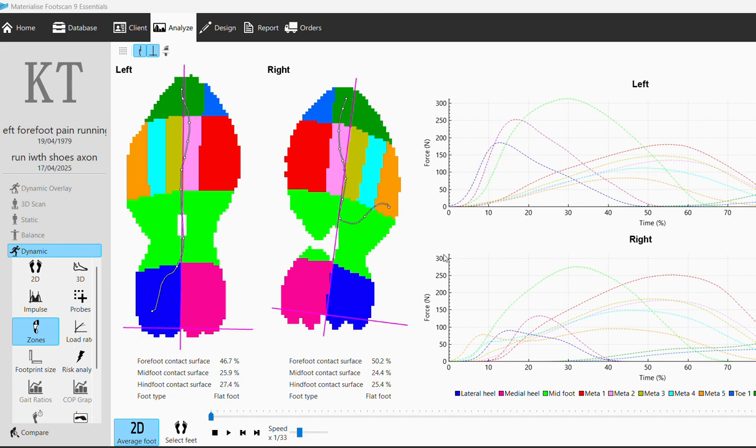And here we can see the force time curves, where we've got the force on the vertical axis and time on the horizontal, showing the amount of heel contact that we have, and for the duration, showing the foot is just working in that flatter position. Again, with that lower forefoot line here, we have less propulsive forces. So again, it's all holding patterns coming through the foot.